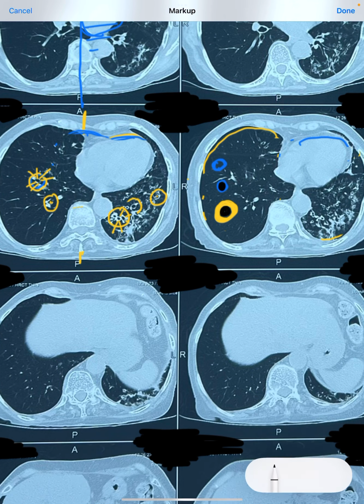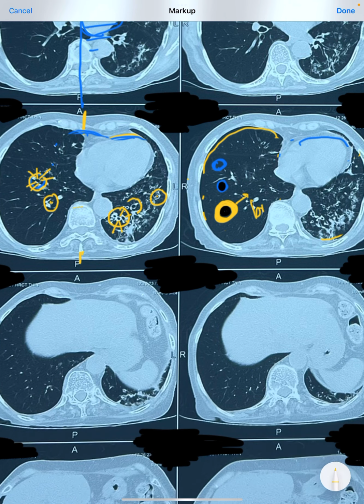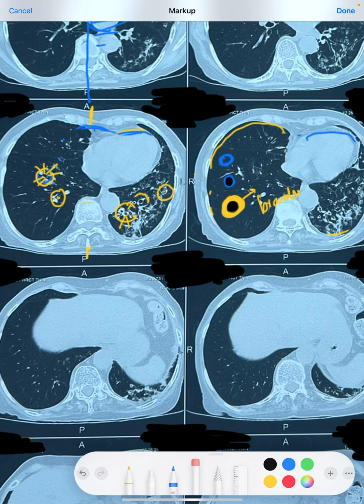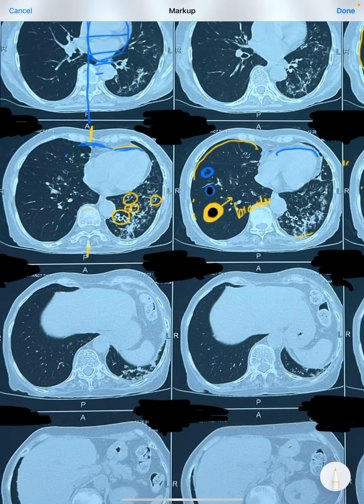This is a permanently dilated bronchiole with a thick wall and presence of air inside, and these are present very close to each other. They should not be present this close. They should be placed apart. So in here there are so many bronchioles which are very near each other with thick margins.